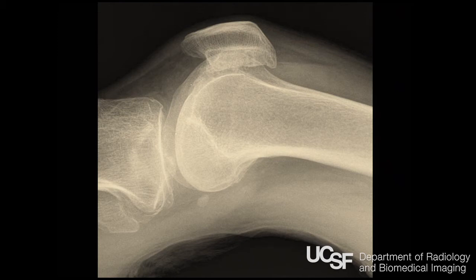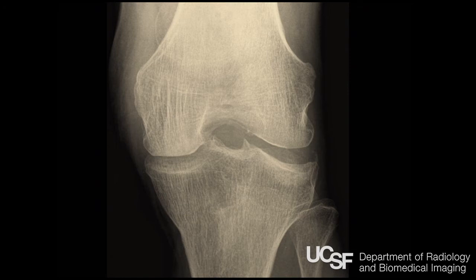Whenever you look at a lateral radiograph of the knee in the setting of trauma, look for a fat fluid level, a straight line right there. Something is broken. We don't know what. When you see that, something is broken. And then get more studies, either a CT scan or obliques, your preference.